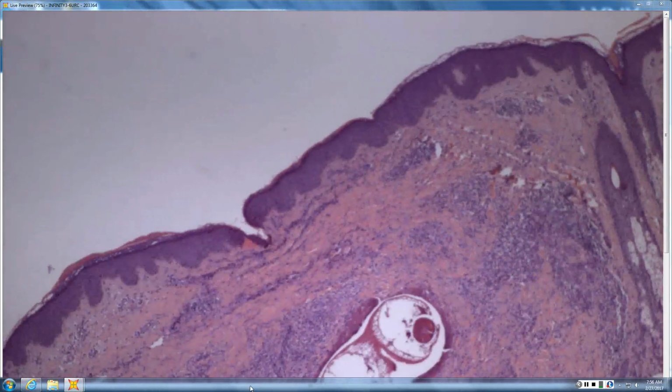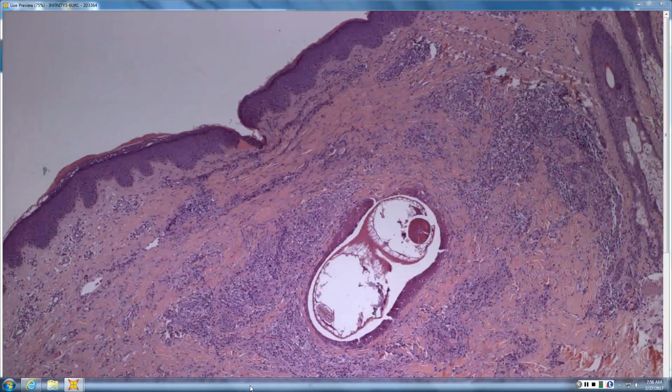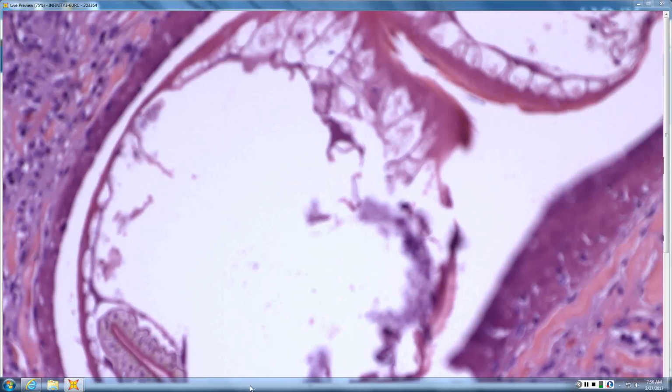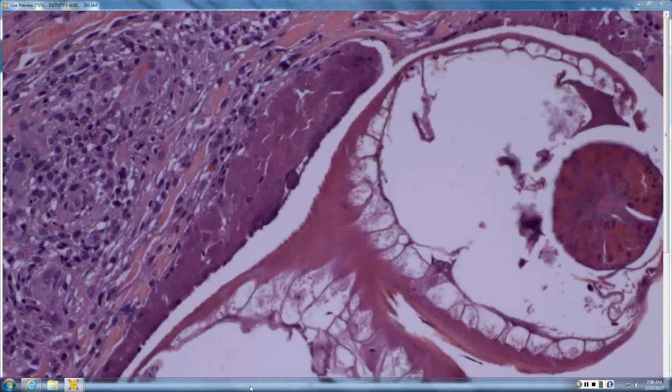So we have, it's like a worm with, is that the bifid uterus perhaps? With like a thin muscular layer? So, a lot of them will have that. This worm, the best thing is it's short and fat, right? So this is a very stubby, fat worm.